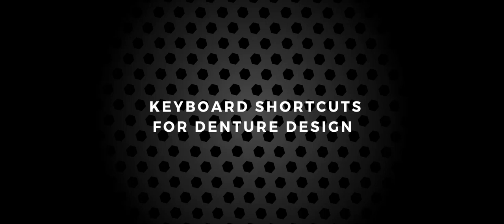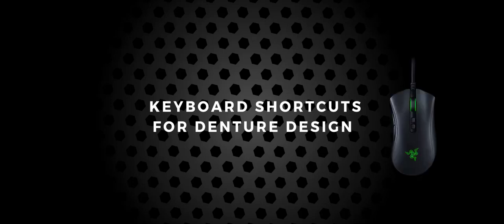Hey guys, I thought I would just share some of my keyboard and mouse shortcuts for when I'm designing digital dentures in 3Shape. So this is the mouse that I have. It has some extra buttons which I like.